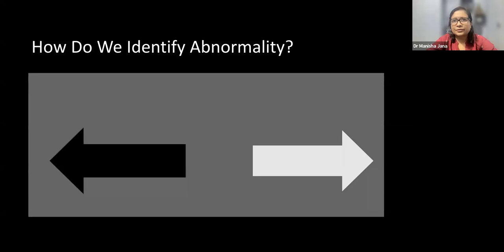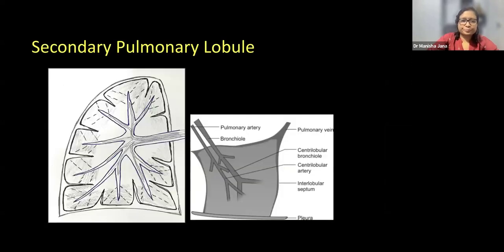The thing that you have to decide is whether you want a contrast scan or a non-contrast scan. Irrespective of non-contrast or contrast, HRCT reconstruction will be done in all, and they will be similar. The difference will be in the visualization of the mediastinal structures, the vessels, the nerves, the nodes, and other soft tissue structures.